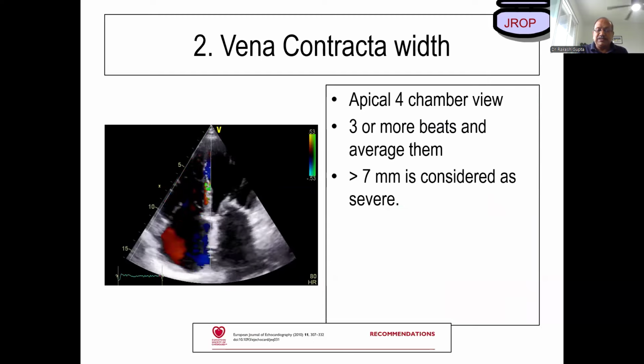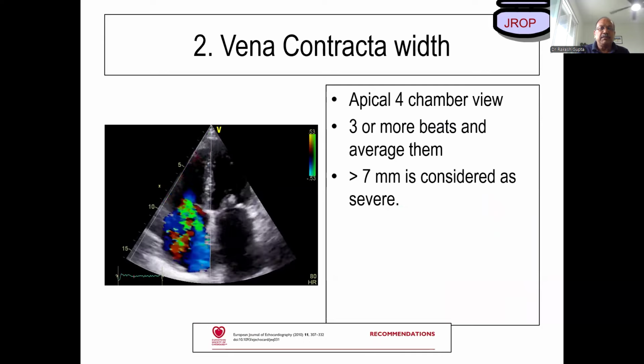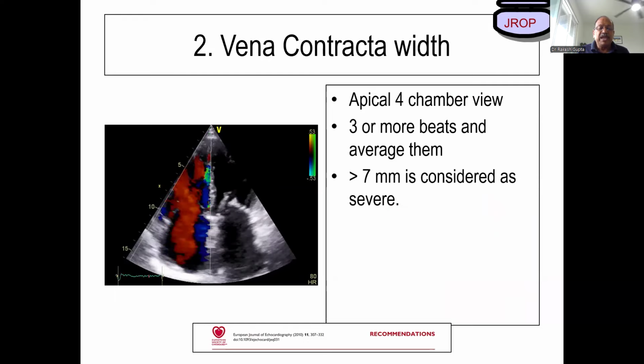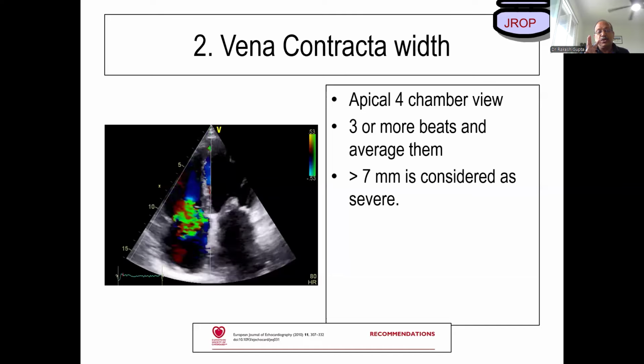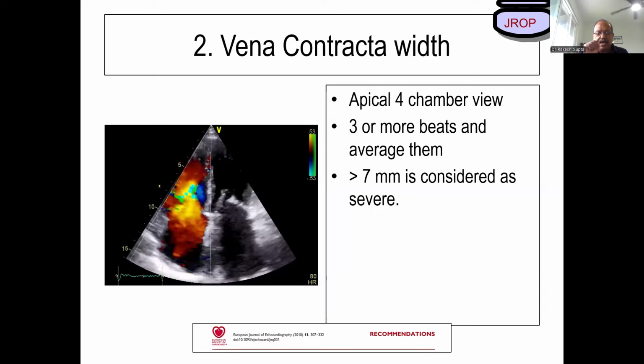And she said one sentence, possibly you remember or not: if you happen to see multiple jets of mitral regurgitation, it will not be evaluated. No, if you happen to see multiple jets, why you're seeing multiple jets is because the mitral valve has got 3 cusps. So you'll find a gap between A1 and P1, A2 and P2, A3 and P3.